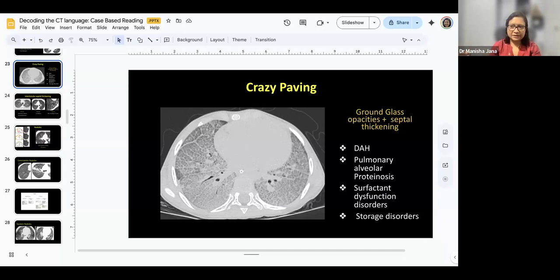I will be seeing the same appearance on the CT scan because the radiologist is trained to see the lesion and make a mental picture of it. But for better visualization, virtual CT bronchoscopy is useful because it gives almost a bronchoscopy-like picture. The basic thing is the same, the acquisition is the same, it's just a reconstruction.